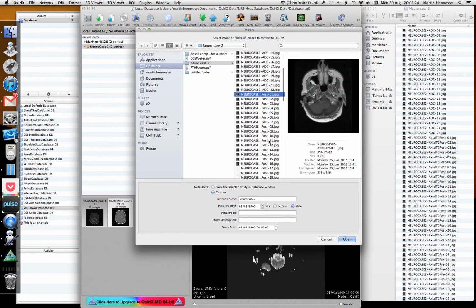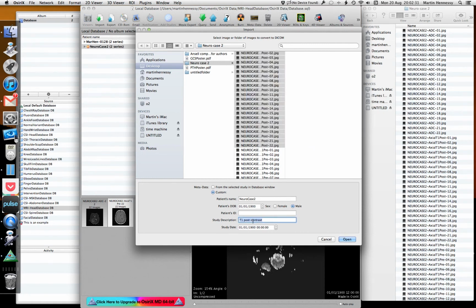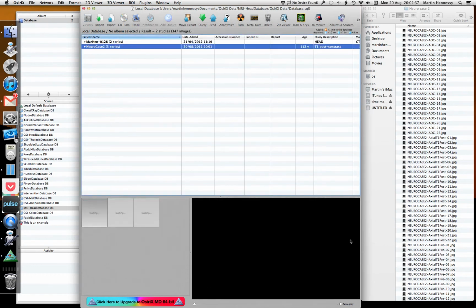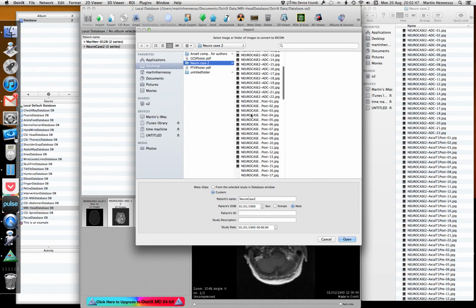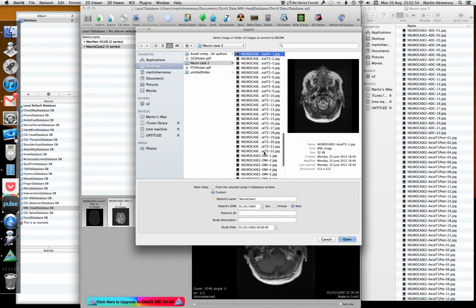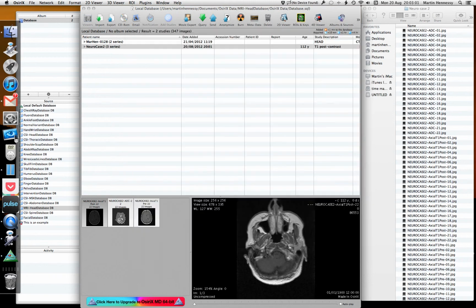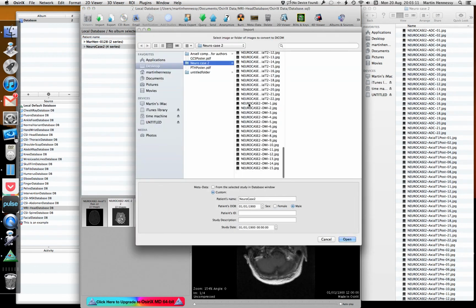So I've done the T1 pre-post, same patient name, make sure the description finally the DWI.